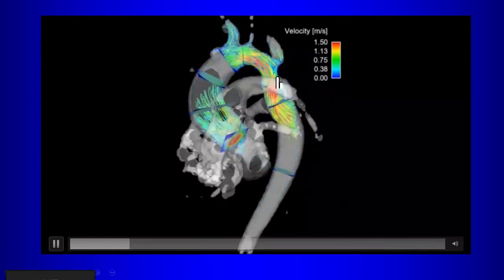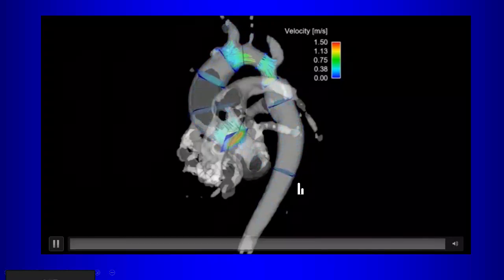Yeah, there's coarctation. So you see there's a little bit of narrowing right there, and you can see that the velocity is higher, right? You see that red? So once you've acquired the information over the whole volume, wherever you see these lines, you can put these lines anywhere. You can take measurements anywhere you want within the vessel, okay?